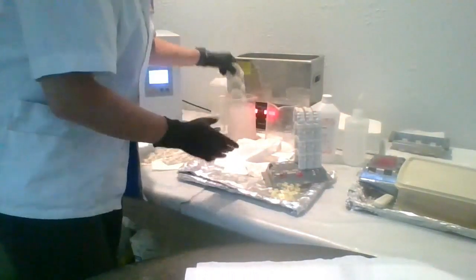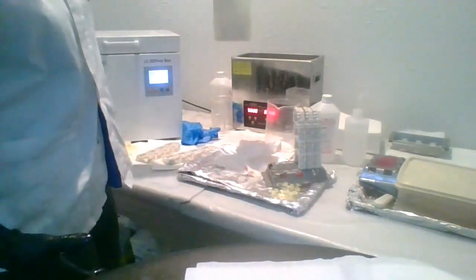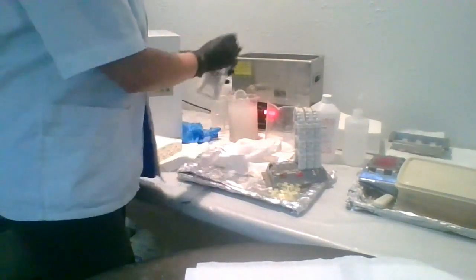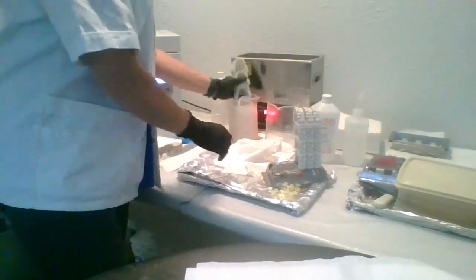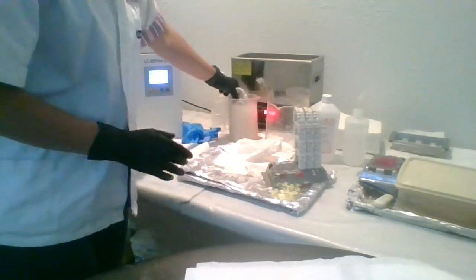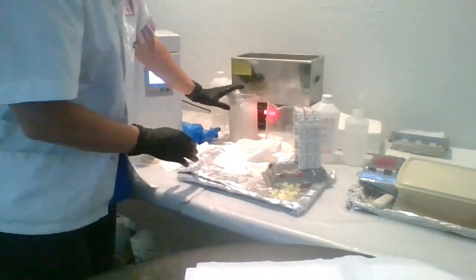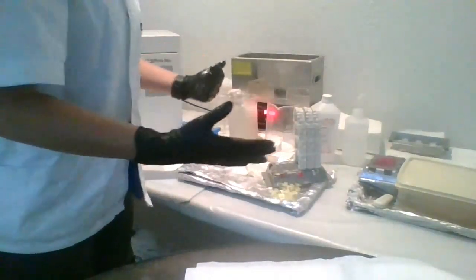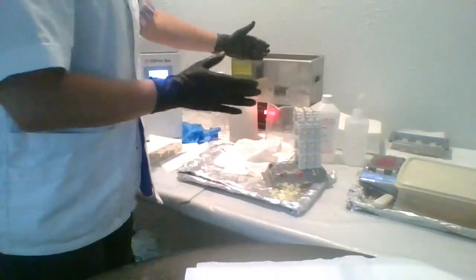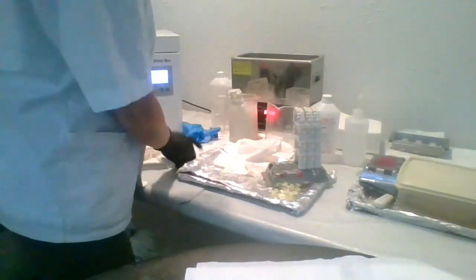So you can put these in your ultrasonic. I'm in my home office right now, so my ultrasonic isn't huge, so I'm just going to use these 1,000 milliliter beakers. Again, just pull off those lingual supports, and you can fit most of your stacks in. Then you're going to put them in for 3 minutes. Halfway through, I like to flip mine, or maybe even go sideways a little bit. In fact, I have a Tupperware that I can put in. You probably have a bigger ultrasonic at your lab, so you'll be able to use a much larger container. For me, it's just a little more difficult here.